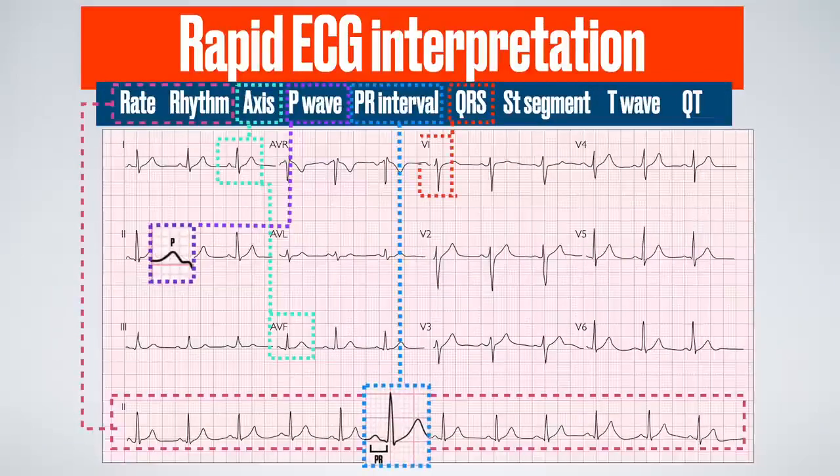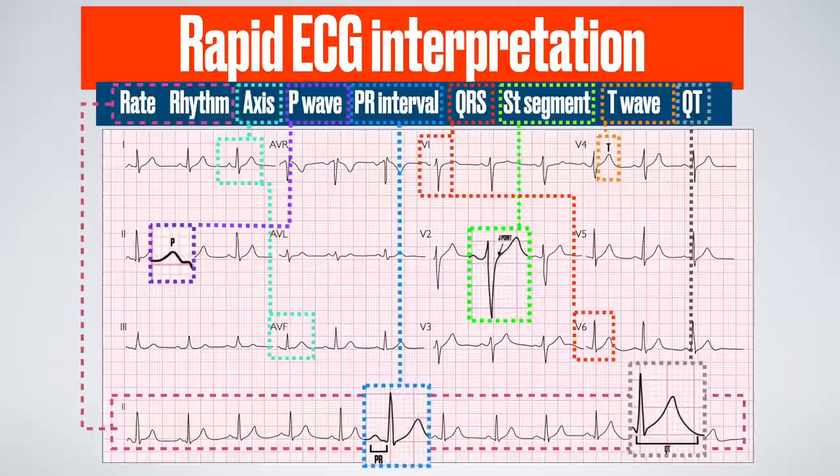Rapid clinical assessment of the 12-lead electrocardiogram covering 30 different ECG presentations that you need to know. There's lots to cover here, so let's dive straight in.